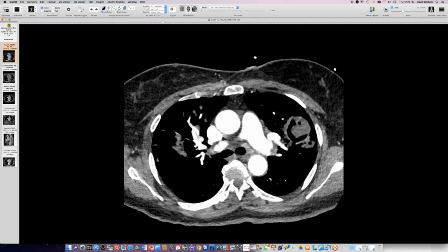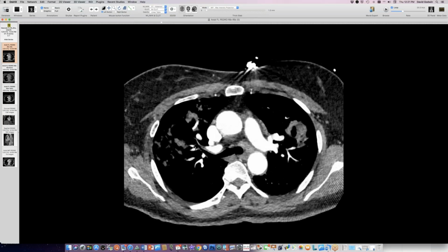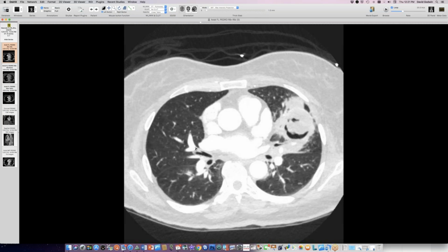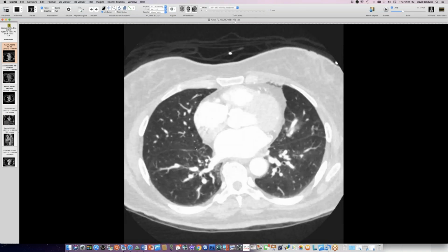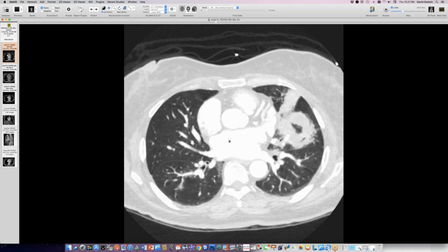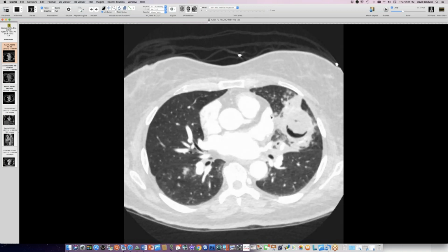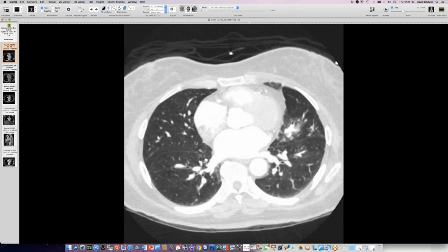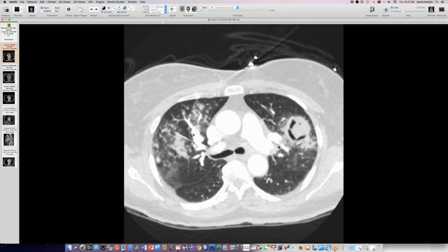So whether she got it in Mexico or in California or in Washington State is hard to know. All 3 places have cocci as an endemic fungus. So fungus 2, this is pretty aggressive cocci. I mean, usually, we will have a couple of smoldering, thin-walled cavitary nodules, but this one is big and necrotic on the one side and then pneumonic on the other side.